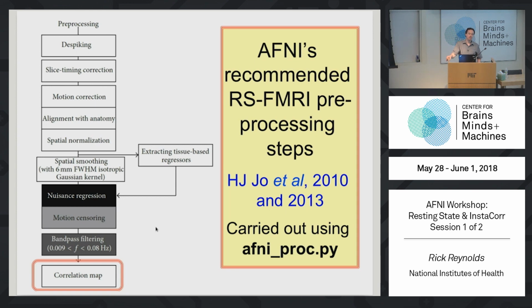AFNI has ICA. We have historically stayed away from that, but we do have Prantik Kundu's MICA package that's multi-echo ICA. So if you're collecting multi-echo data, we do have an ICA technique for that, Prantik's. The reason we're slightly more comfortable with that is that it's at least using the fact that you have the multi-echoes to detect which time series seem to be more of a BOLD effect, in which case you'll have a decay of the magnitude.